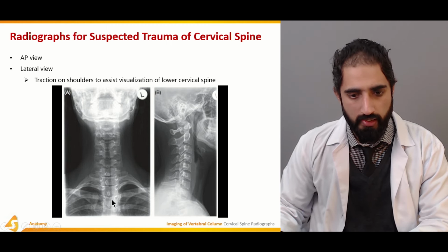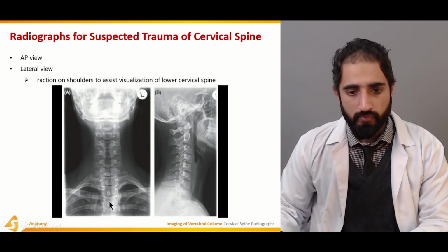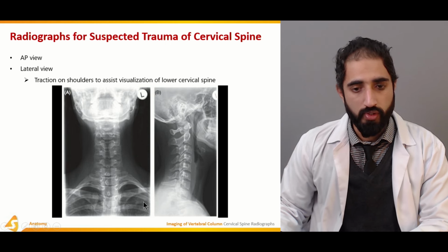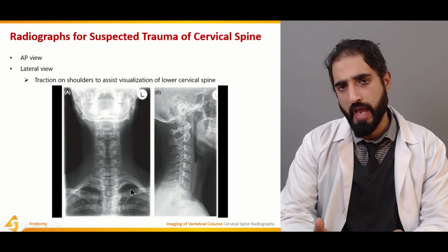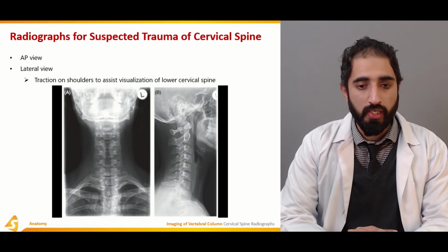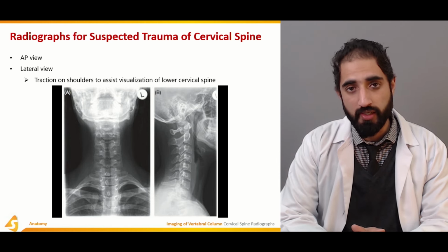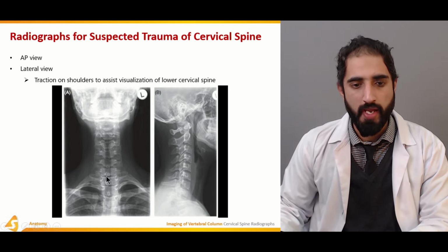There is slight angulation over here, this is the left side, which is actually the convexity towards the left side and concavity towards the right side, and that is perhaps because of the hand dominance, which is known as the handedness posture, and that can perhaps be the reason of this. Otherwise, it's pretty much a normal x-ray.